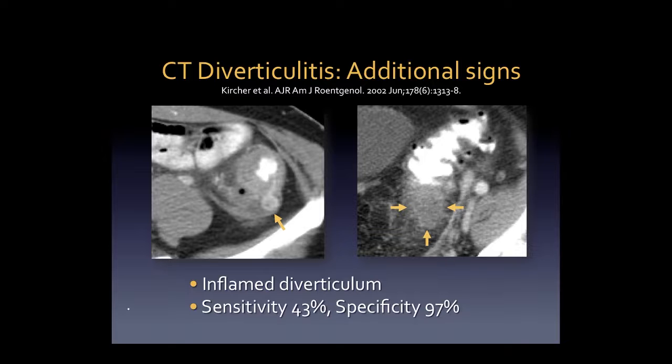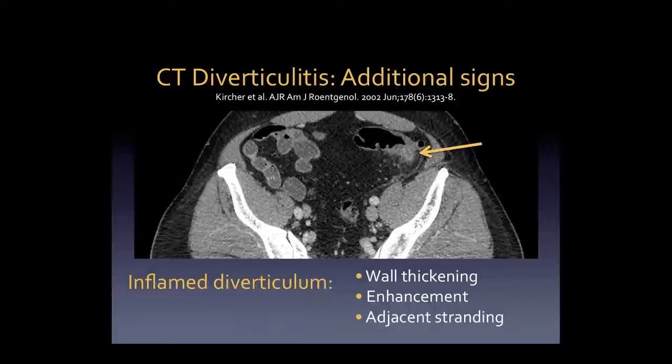Now, one of the best signs I find for making a confident diagnosis of diverticulitis is to find a single diverticulum that is definitively inflamed. They can have a number of different appearances. Here, the first is thick-walled, hyperemic, with some fluid right around it, and looks definitively inflamed. The second image, that diverticulum almost looks phlegmonous, but both of these cases are definitively inflamed diverticula, leading to a confident, specific diagnosis of diverticulitis. Here, another nice example of a focal inflamed diverticulum.